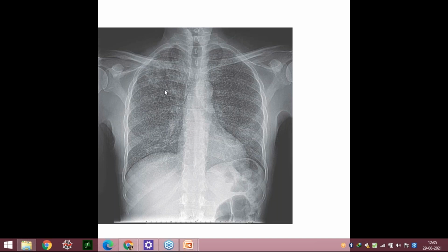However, in both the lung fields, you're finding very fine. It is not patchy consolidation. Yeah, it is very fine consolidation which is there. Very small tubercles, if you would say, or millets. So that is there, and it is there in the entire lung field on both the sides. So the most common differential for this would be miliary TB. However, that is what is expected from you.